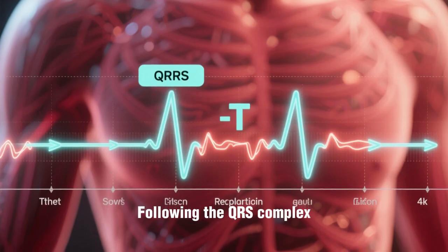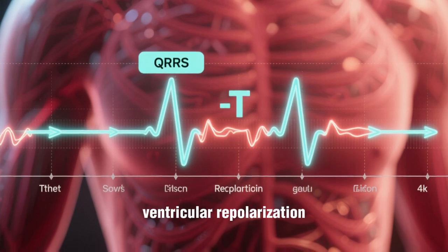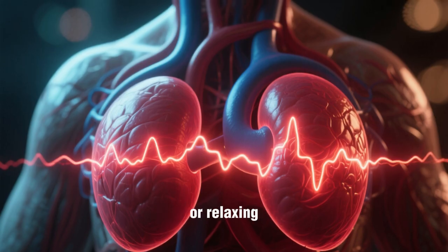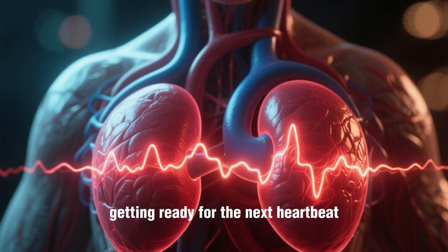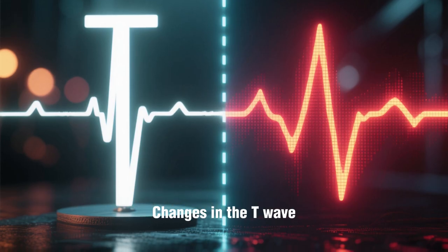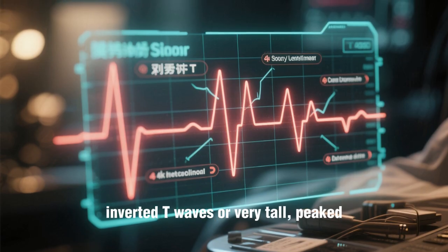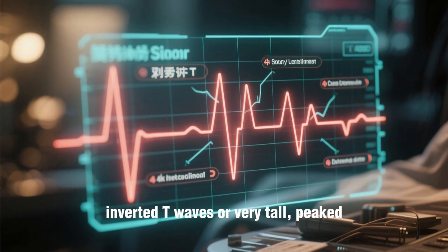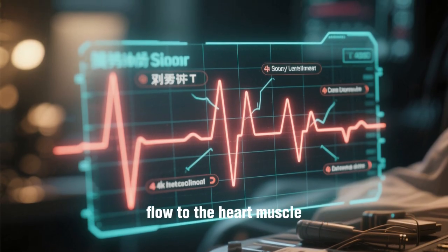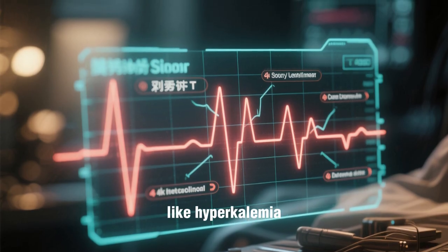Following the QRS complex, we have the T wave. This wave represents ventricular repolarization. This is when the ventricles are electrically resetting or relaxing, getting ready for the next heartbeat. A normal T wave is typically upright and rounded. Changes in the T wave can be really important. For instance, inverted T waves or very tall, peaked T waves can be signs of myocardial ischemia, which is reduced blood flow to the heart muscle, or electrolyte imbalances like hyperkalemia.